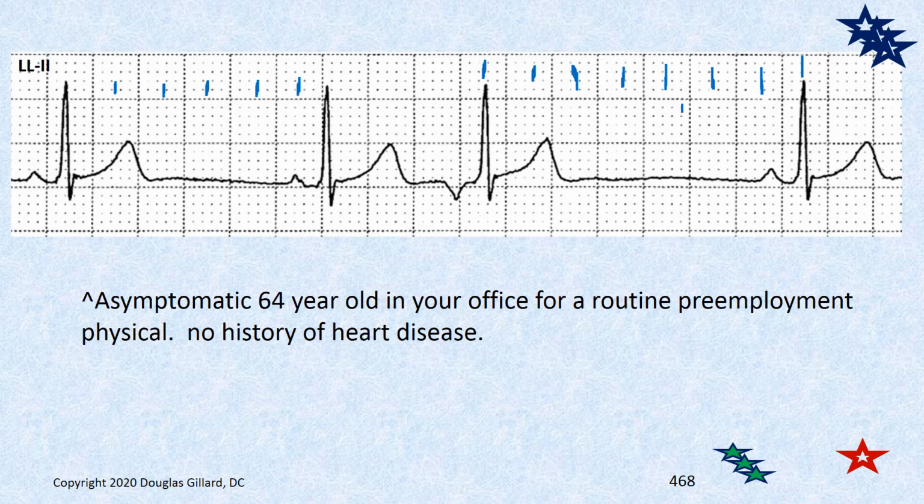So another way you can tell, kind of hard to eyeball, but after a PAC occurs, you get what's called a compensatory pause. So the following RR interval will be longer than the normal RR intervals. It's called a compensatory pause. It's probably a good one to put in. Comp pause for next quarter.